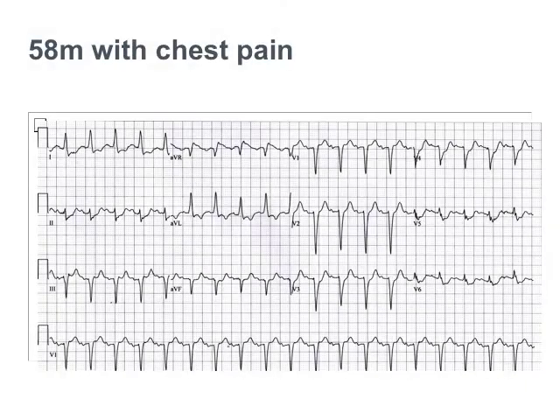All right, so let's start with an ECG. This is a 58-year-old male with chest pain. You may want to pause this lesson for a moment, have a peek at this ECG, and then we'll go over what we're looking at here shortly.